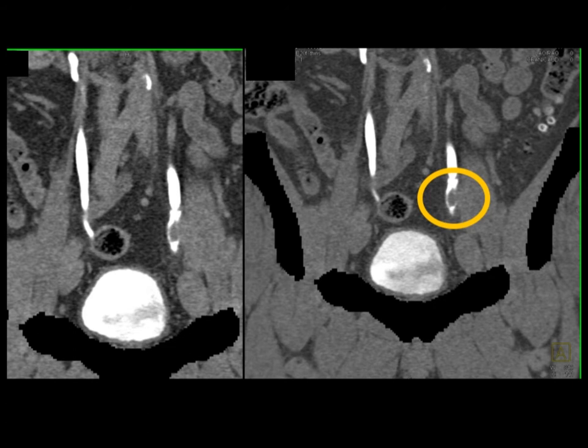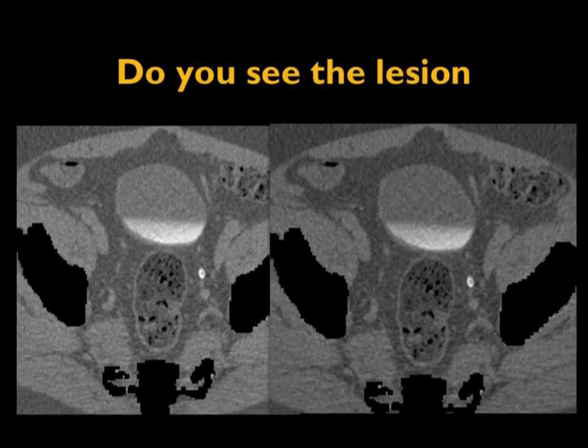Look how nicely you can see the mass present in the ureter. That's a transitional cell carcinoma, but notice the ureter is not dilated above it. Just a really nice example of a 1 centimeter transitional cell carcinoma. And here's that same image in 3D, very nicely showing you the pelvis and the ureters and the lesion in the patient's left ureter. Another example, very similar.